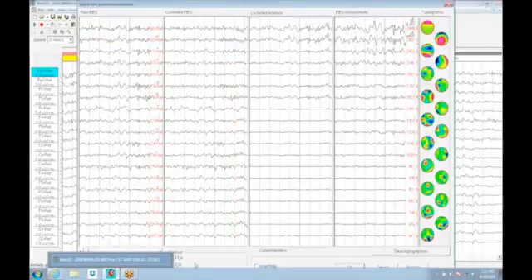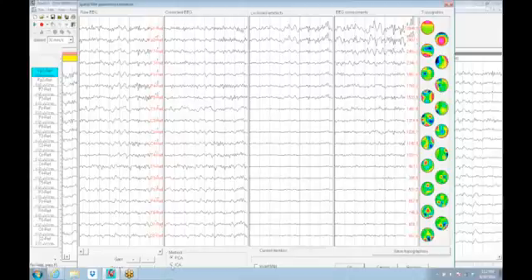This is a learning software, and the learning software has executed PCA, principal component analysis, originally. And the PCA, you can see, is not spatially distinct. The components aren't all easily identifiable as a spatially distinct generator, and some of these look like badly inoculated petri dishes with little islands of stuff all over them. Now, by contrast, the independent component analysis can be done.